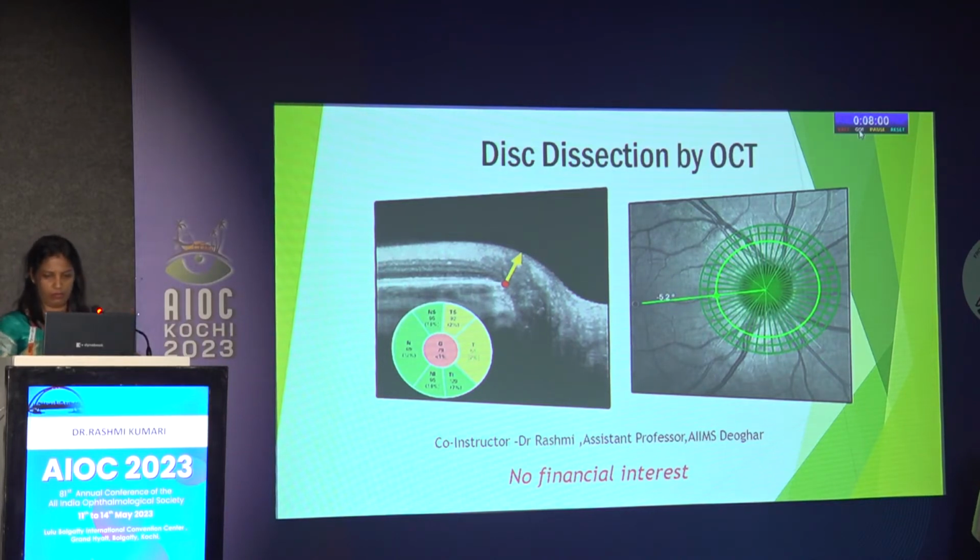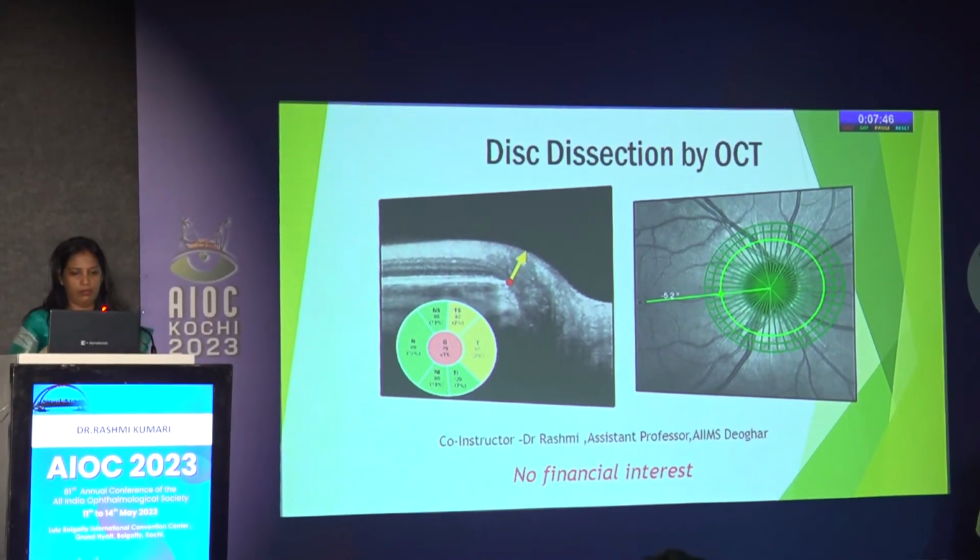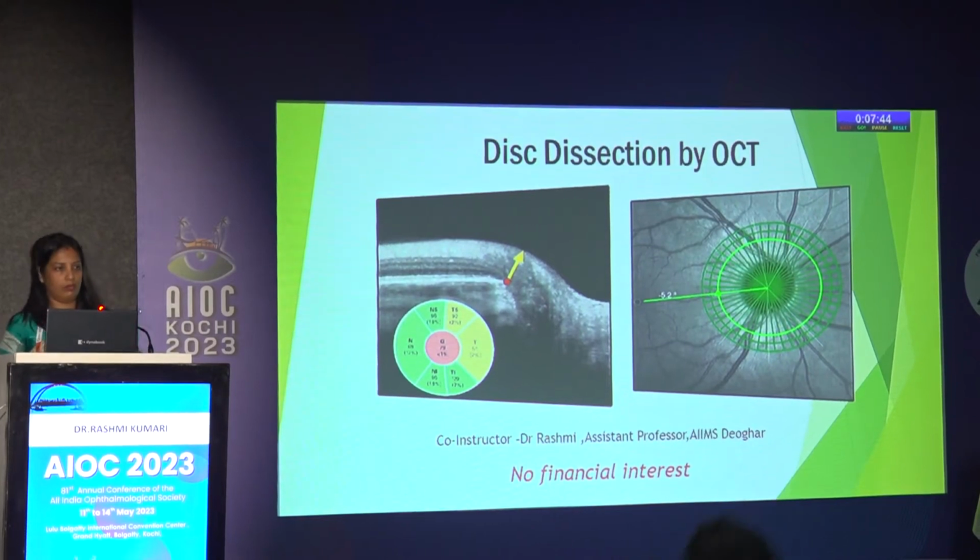This OCT is again giving a lot of information regarding the disc analysis, and when it correlates well with your clinical findings, it enhances the chances of correct diagnosis.